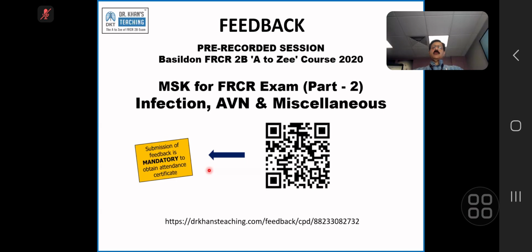Osteosarcoma malignant differentiation. The main point was that there was soft tissue ossification. There should not be any soft tissue ossification next to the lumbar vertebra. That told us that there is something wrong, and there is malignant transformation, and this is an osteosarcoma.